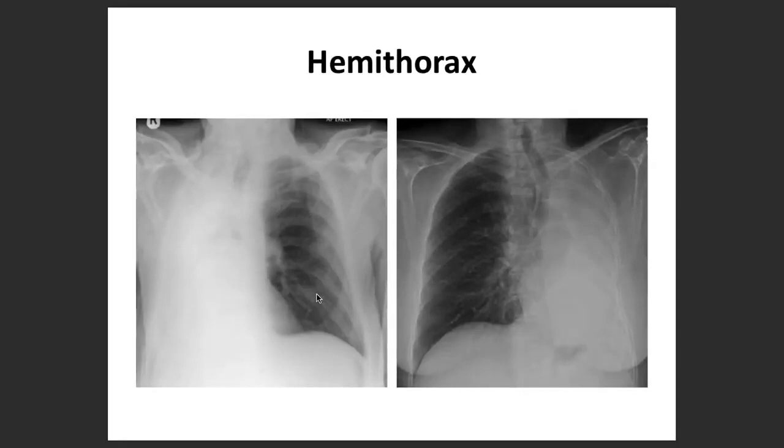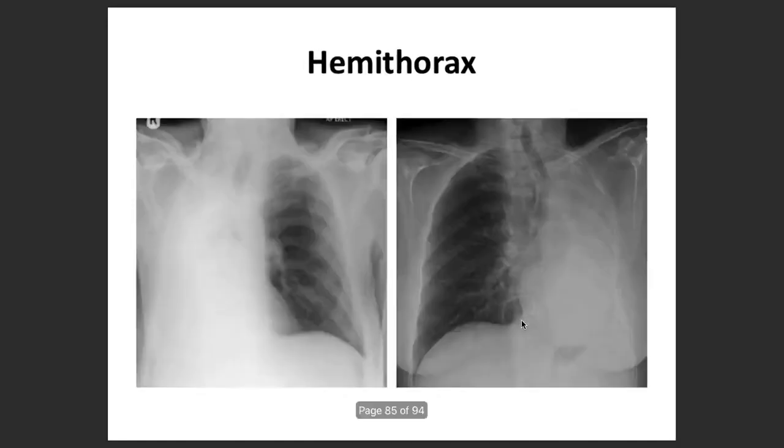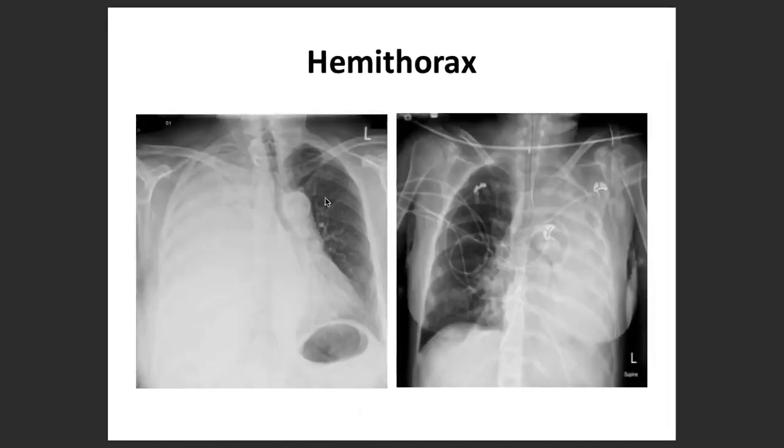For example, in this, if you notice, and this as well, towards the opacification. Otherwise, the third thing is that it will remain in the middle. So these are different types of opacification. In this one it is remaining in the middle, in this it is getting pushed towards the opacification, and in this it is away, right? So these are the three types.